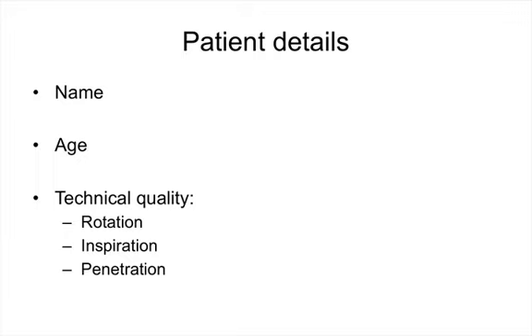When presenting a chest radiograph, or indeed interpreting a radiograph, there are several essential bits of information that you need to comment on. First of all is the name of the patient and their date of birth. Then whether it is a PA or AP view. Next, you need to assess the technical quality of the film. If the film is of very poor quality, then it's unlikely to be of clinical use.